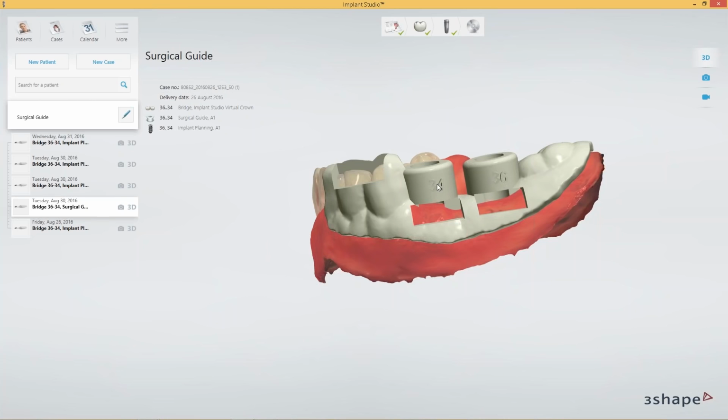Thank you. It's another good example of being creative and how to use the different features we have available. What you can already see here is that using viewing windows is a key element to play around with how an actual design appears at the end, but also what kind of option it's going to give to the user.